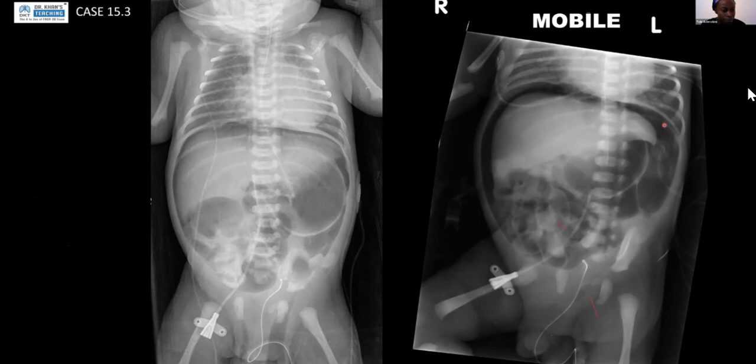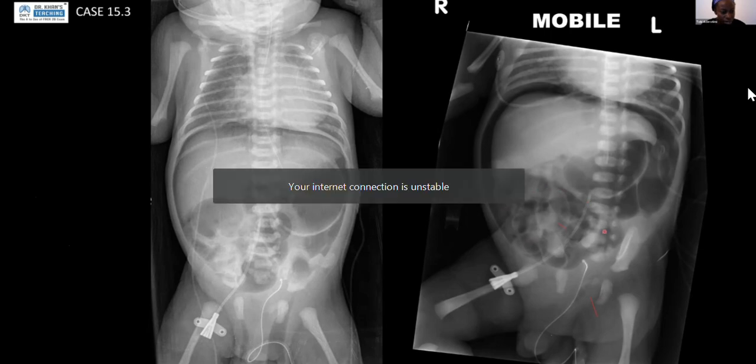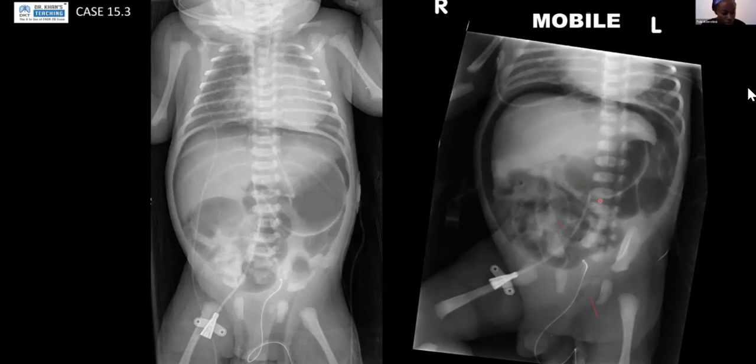Sign, and we've got this triangle of gas here as well. Remember that I said intraluminal bowel gas does not form triangles. So if you see a triangle of gas, you've got to raise the concern for pneumoperitoneum, and you can further confirm that with a lateral shoot through.